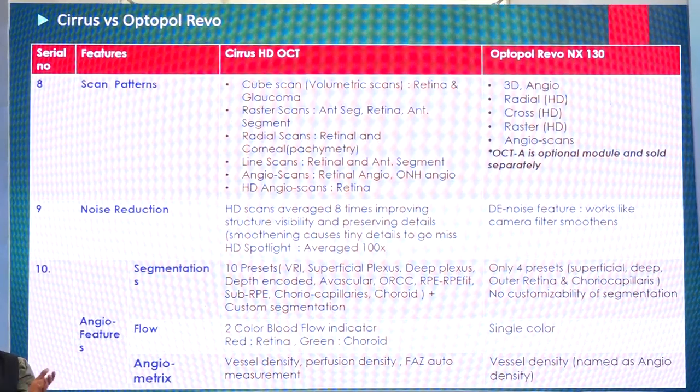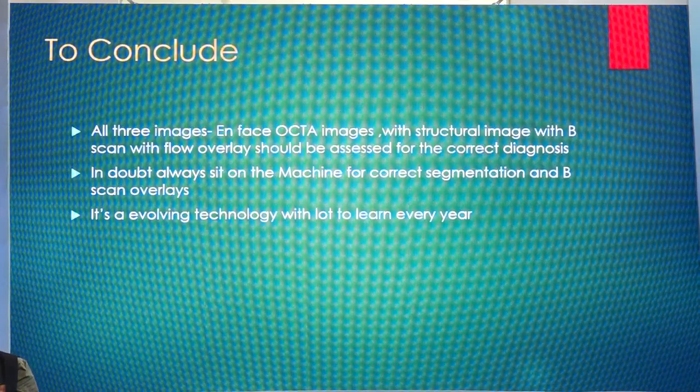Optovue, I personally have not seen this machine. The pictures are not very good. So I will not recommend Optopol or Optovue to you.